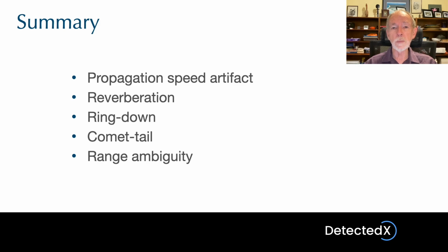Reverberation is important because it does happen frequently within the abdominal wall and the various tissue layers within that wall, and it therefore causes a series of artifact echoes to be displayed deeper, for example in the liver, degrading the quality of the image. Ring-down artifact occurs mostly with gas bubbles, and it can be useful if gas bubbles occur in areas where you don't expect to find them. But most of the time it's a problem, or at the least something that doesn't help you.